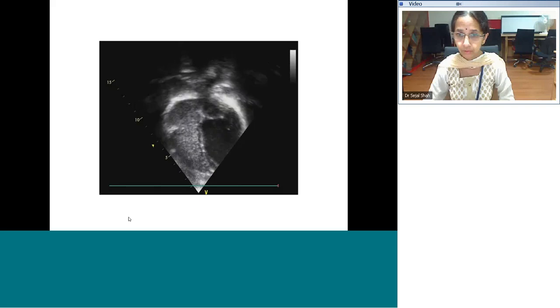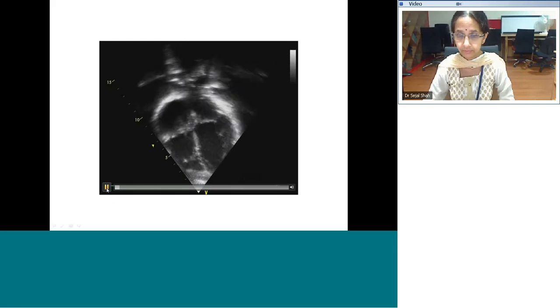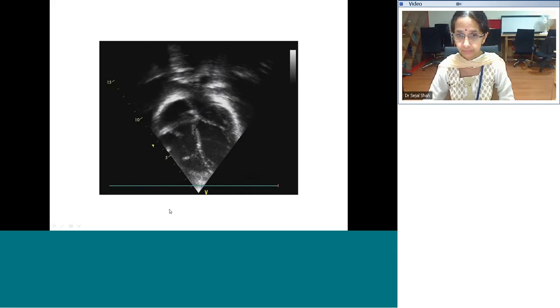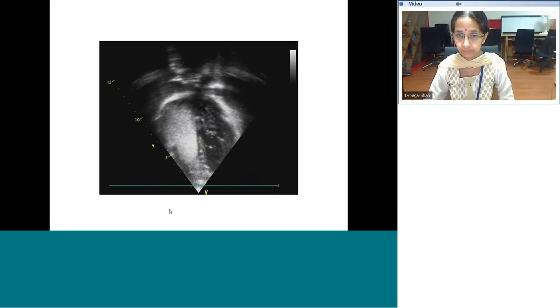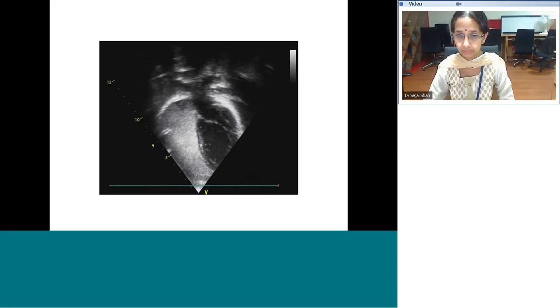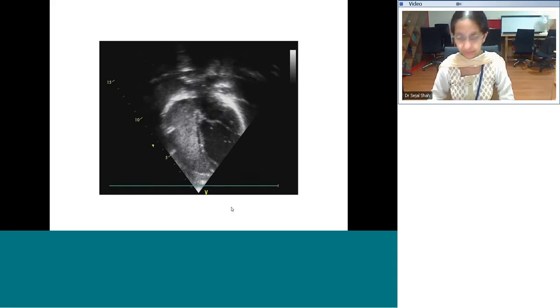So I'm sure all of you know what type of study is this. Yes, so it is agitated saline contrast echo, that's right.